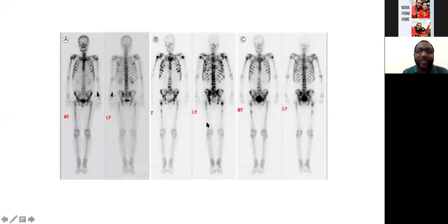So normally what we do in this patient, that's why history here is very important. The clinical state of the patient is very important. And the staging bone scan is also very important to determine whether this is indeed a flare phenomenon or not. But this bone scan was repeated 6 months after, and you can see there is almost complete disappearance of those lesions that had flared up earlier on.